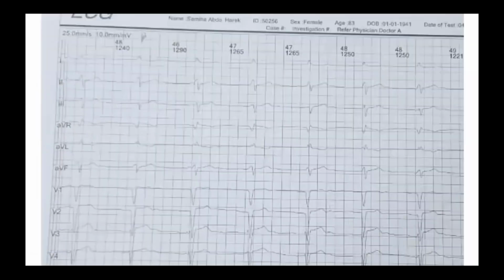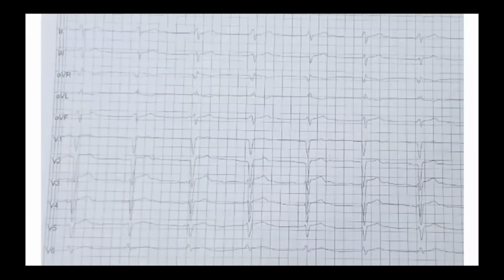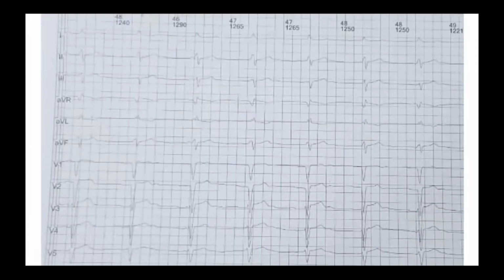The quality is not good. But do you see any P wave? Look in lead 2. No P wave. Actually, there is a P wave, but it is slow, just before the QRS complex. Put a marker on it.